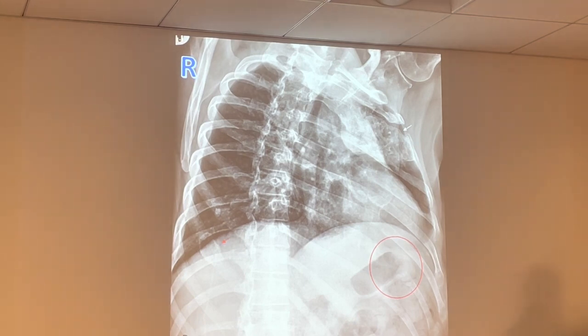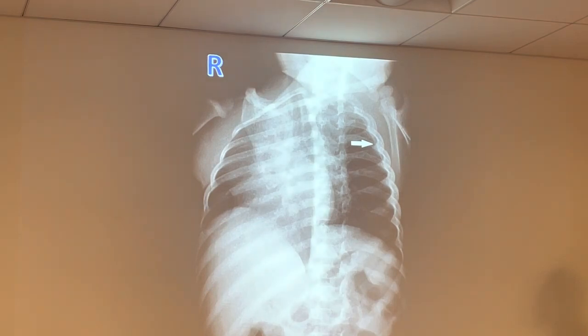Good. Remember when you said that when they're abused, there are those little healing fractures, contusions? Yes. That's a mass healing fracture there. And right there with a little arrow, that's completely separated. That's also a fracture as well. Healing fracture.